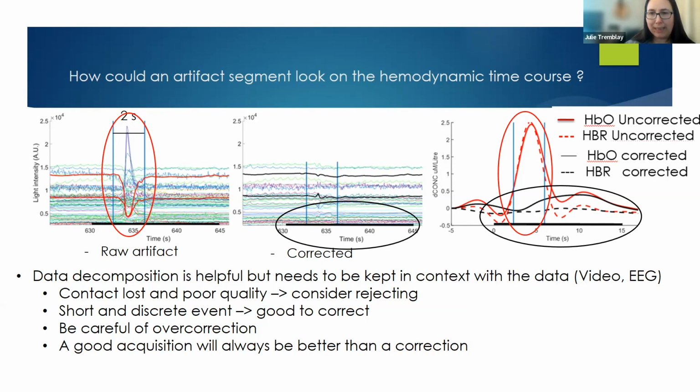It is important to keep in mind that data decompositions are helpful, but need to be kept in the context of the data. If they are available, it's always good to use the video and EEG to understand what's going on and keep notes of your recording. As we just observed, uncorrected data could greatly affect the outcome of the analysis.